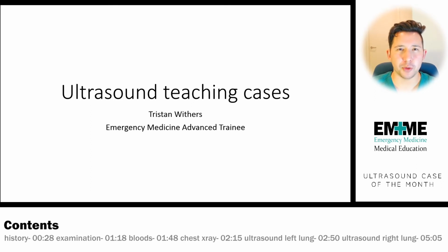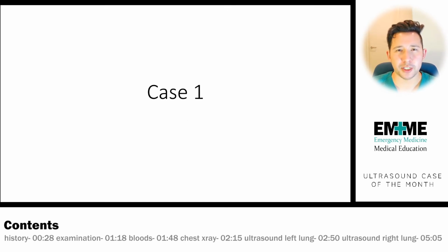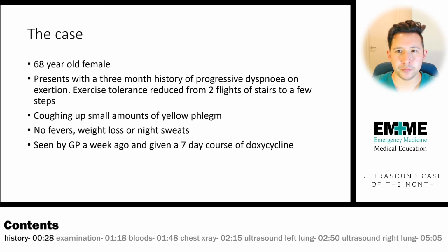My name is Tristan Withers and we're going to be going through a case today where we used ultrasound, and I'm going to talk you through what the pictures mean, how to interpret them, and how it changed the management of the patient in today's case. This is our first case and let's get straight into it.